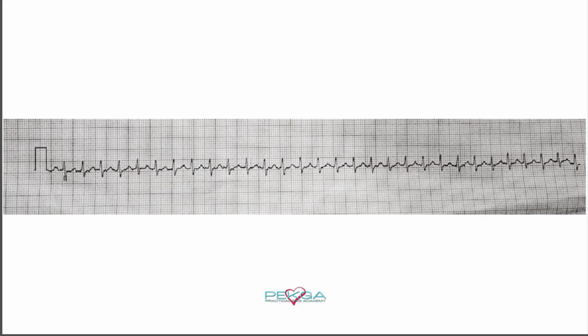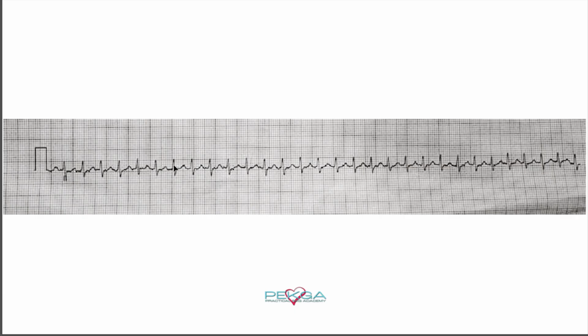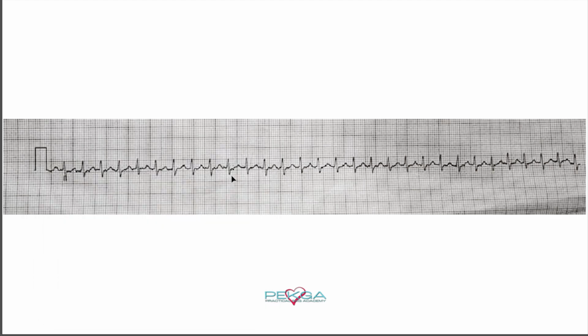Today we're going to be taking a look at this 12 lead, very fast rhythm. However, as usual, we are going to be breaking it down and we're going to be starting off with a single channel view. So let's take a look at this.